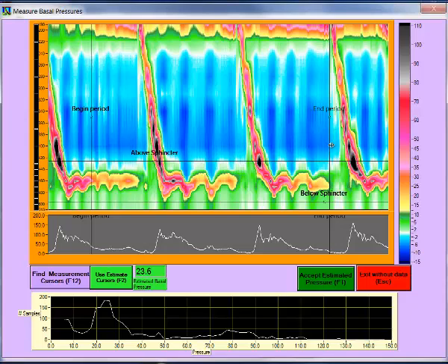The concept of this is that the sphincter spends most of its time at the basal pressure, which will therefore be the most common pressure recorded. However, you need to be sure that there are not too many swallows in this data, or you will in fact measure the nadir pressure.